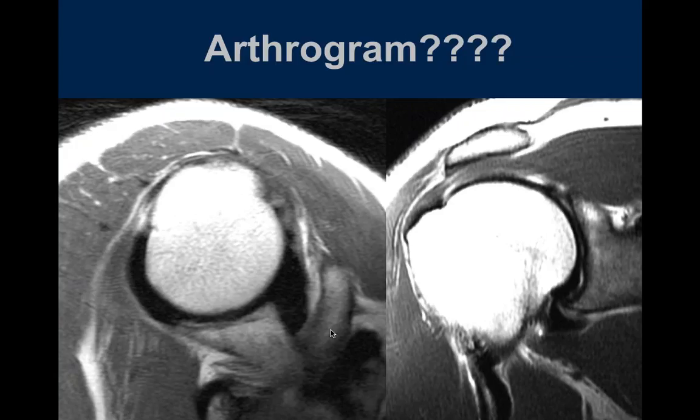Did you say air? Not likely. I wouldn't think that air would be conforming to the anatomy like that. I would imagine it would probably be non-dependent, and it also seems to be located inferiorly within the coronal as well. So I think it's fluid. I think it's a fluid collection.